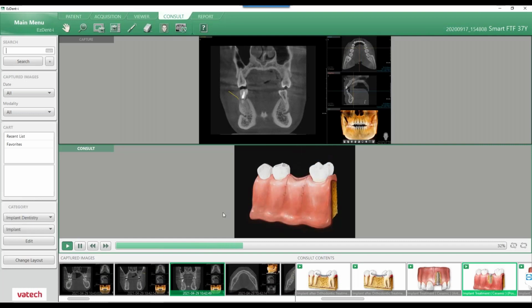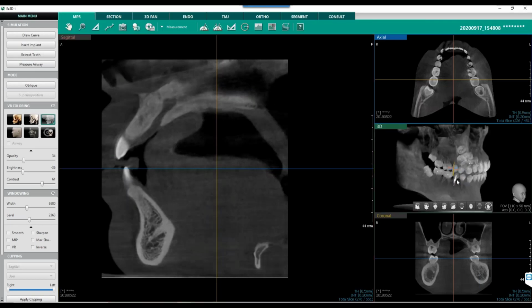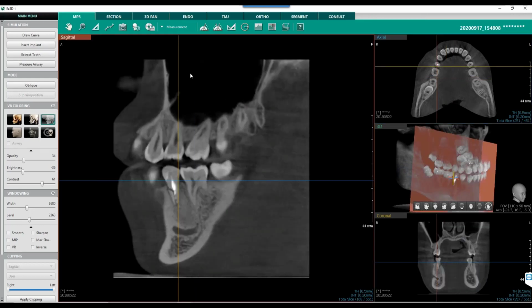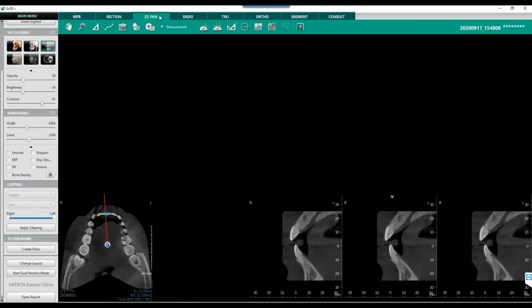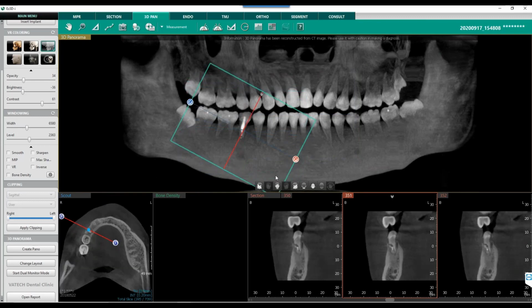So let's do a quick recap before we end our session. We started with a smart scan. We looked at tooth number 29, where we navigated on the MPR window over to that tooth and looked at the different sectional planes of view. Well, then we did what? Our different filters here, the sharpen, the max sharpen, and inverse. Yep. Then we navigated to the 3D pan and manipulated it in there to visualize that fracture.